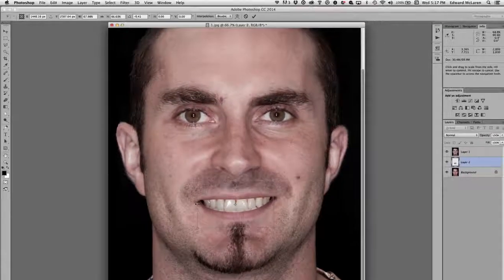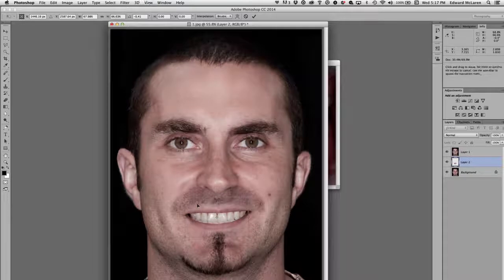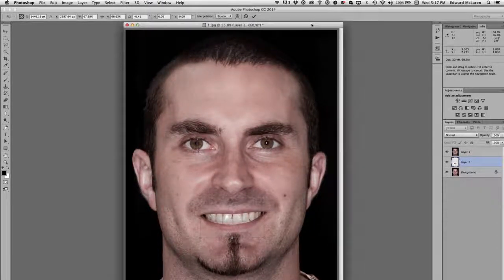All right, I'm going to zoom out a little bit, completely zoom out, Command or Control 0, so that now we can see the full face here. Now if I wanted to apply that, I do. Now if I get out of that, if I want to apply that, I kind of like that, maybe up or down just a little bit. All right, great. I hit the Enter key. All right, so I just put a new smile in his mouth, and I said, maybe I like that, maybe he likes it, maybe he doesn't like it.